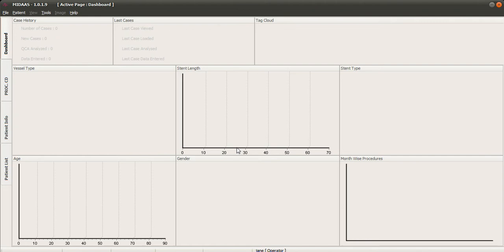Jane is entered as an operator, and here she can upload all the data, and this will go under Jane. The data will be visible to the administrator because Jane has been created as a user under the administrator. After 15 days, the password would expire and the data visibility will be with the administrator.